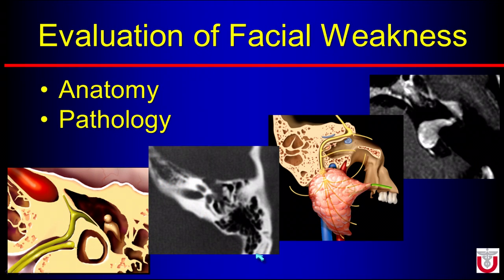So that's a review of the anatomy and the pathologies, the common things that we see along the facial nerve itself. This nerve is very complicated. We've got 3 central cranial nuclei, so we have 3 major functions of the nerve, and it has a tortuous course through the temporal bone, and if pathology happens along different segments, because of the subtle architectural changes in the osseous bone, the same tumors may have different appearances based on where they show up.